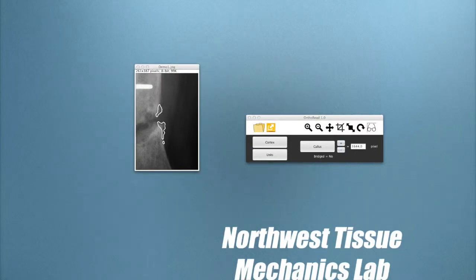You'll notice that OrthoRead segmented and outlined the callus for you. You'll also notice that in the results field, you have a pixel value measurement for that callus. Conversion to millimeters squared is possible using a hardware feature of known dimension, but we'll be covering that in the advanced video tutorial. Here, we have covered the basic steps in using OrthoRead to segment and quantify fracture callus.